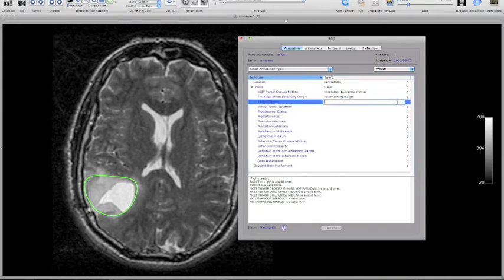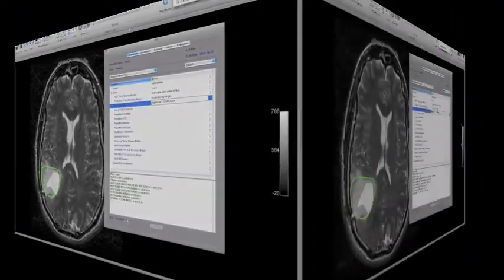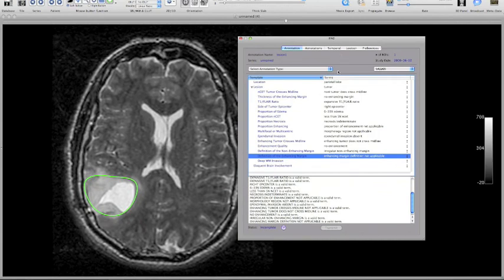One more. And I can just choose the drop-down menu if I don't know what the annotation is and choose a term that's applicable. I'm going to pause for a second and add the rest of the annotations. So I've completed most of the annotations after that short break. I'm going to show what happens if you put in a wrong term here.